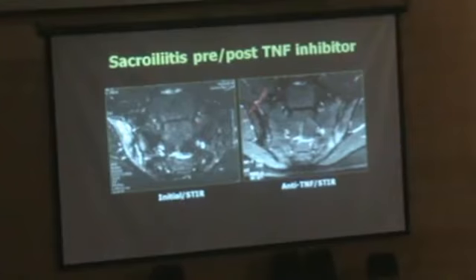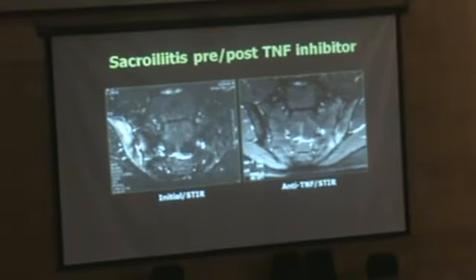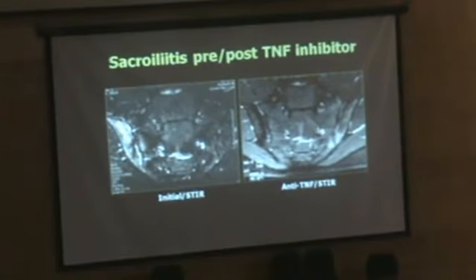And this is an example of a subject. He was diagnosed with ankylosing spondylitis. So initially he has this very important right sacroiliitis with a lot of bone marrow edema, high signal intensity within the joint, maybe some sclerosis or even some fat here. As the repairing process, we're going to see fat subchondrally. The left side is pretty much okay in that coronal STIR sequence.